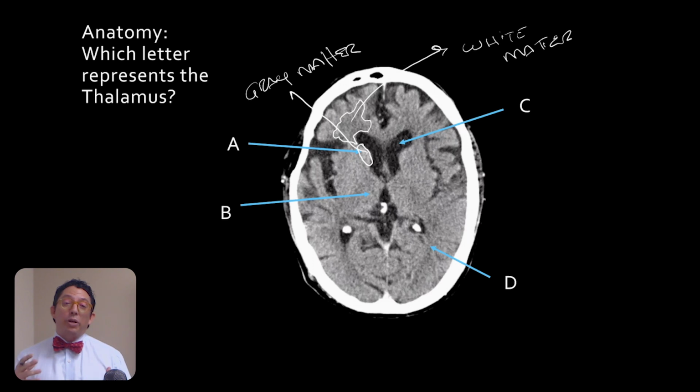So there's a couple of reasons why this happens. First of all, the white matter is where most of the brain neuron extensions, which we call the axons, live. It's more loose, so it has less density than the gray matter, where you have the cell body itself, which we call the somas. They live very tightly together. That's why the gray matter has a higher density than the white matter.